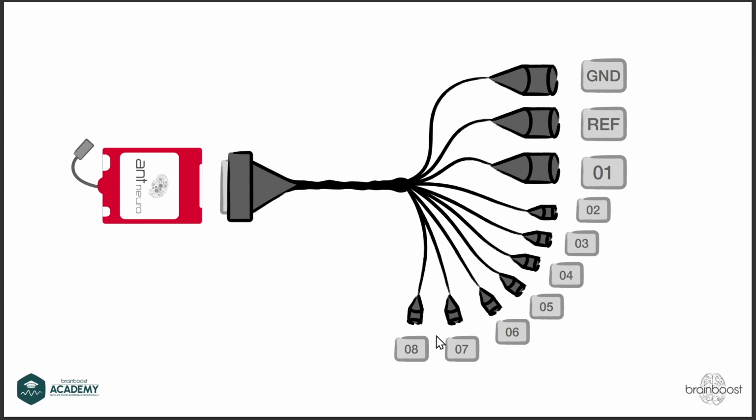And then I have channel 1 to 8. And all these channels need 1 reference, right? Mastoid, behind the ear. That's it, I'm fine with it. So channel 1 refers to that 1 reference. Channel 2 refers to that 1 reference, and so on. Now, if I want to do a bipolar training, or I need several references, then I need to create that.